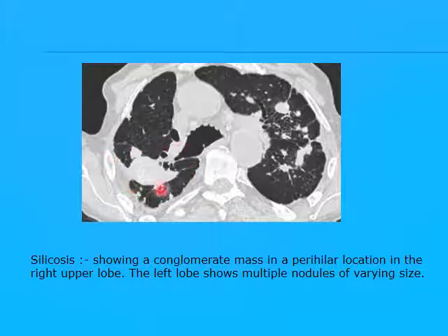This is what I have told you about progressive massive fibrosis. You see a mass-like lesion, but it makes shrinkage of the surrounding lung, crowding of the lung markings, denoting that it is a fibrotic, not a growth mass. Okay, and it likes the posterior portions of the upper lobe.